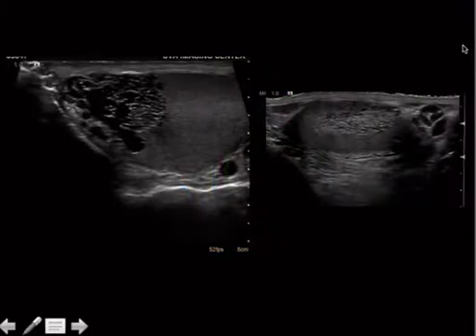All right, so moving on to the testicles. This is a normal variant. It is often seen, but sometimes, so these are two different cases. This is sort of a more mild one here, and this is a little bit more fulminant.